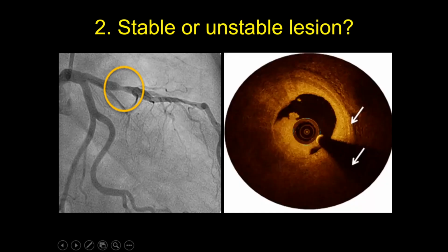And the OCT of this patient. Yasir, there is no goalkeeper. You just have to score. Unstable now, because we have seen that there is some thrombus and something is happening there. Okay, unstable. So I think I'm proving my point, right?